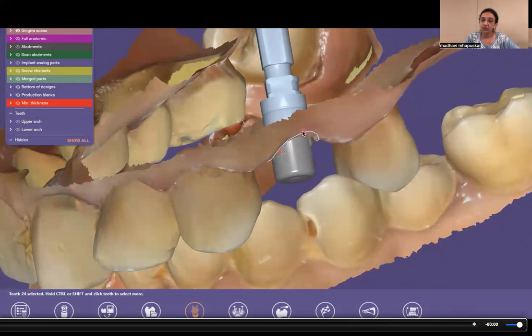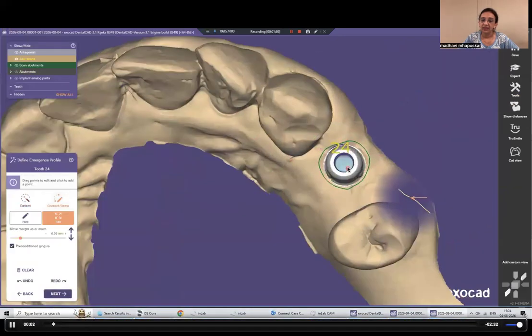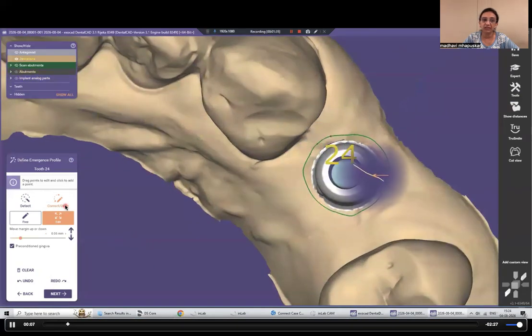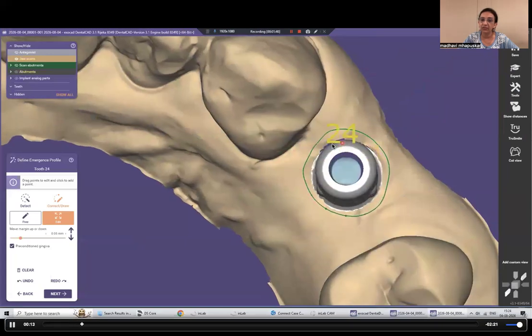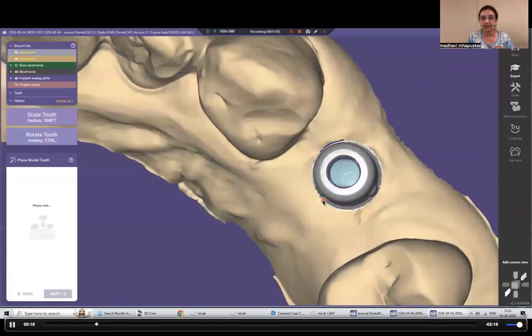Also, if you choose a greater height or you choose a 6 mm, it will interfere with the opposing dentition. So you need to choose the appropriate gingival height as well as the appropriate chimney height according to your clinical case. Once the Tibase is chosen, you will then mark out the emergence profile. So you could either draw it or you could allow it to be detected.